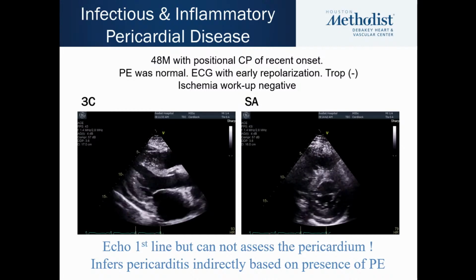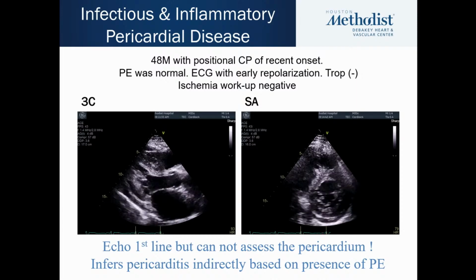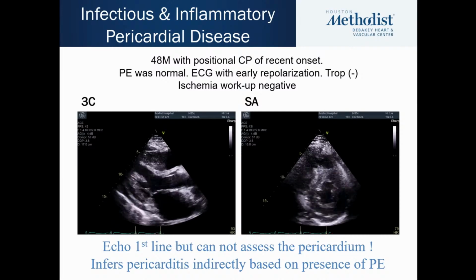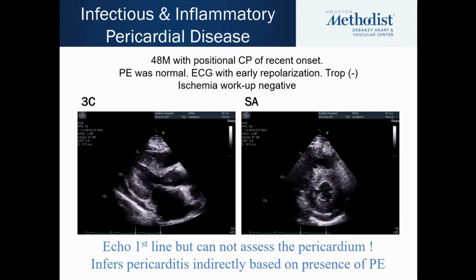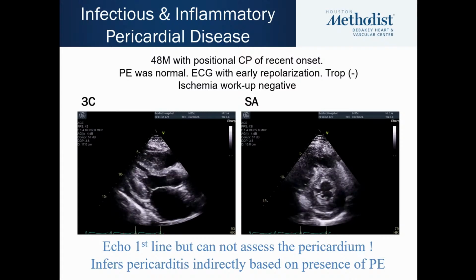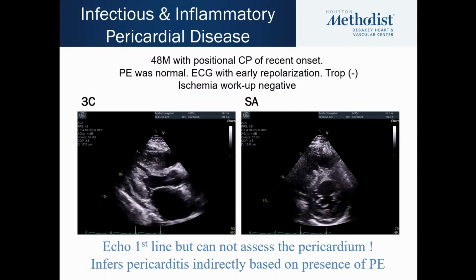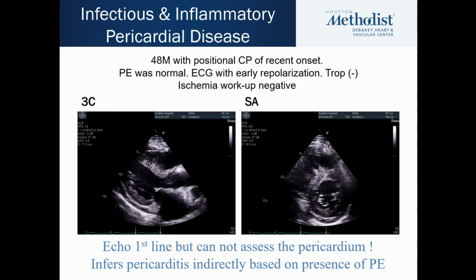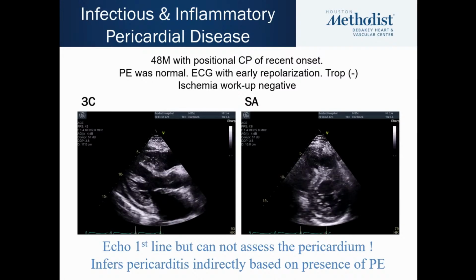And then here are the echo images. And I think we'll all agree, image quality is very good, function looks great, both of the left and right ventricles, the sizes look good. And you may notice that there seems to be a little bit of an echolucent space in the posterior lateral wall. Now, 2 points I want to make. One, I think this was mentioned earlier by Dr. Malahfji, it can be difficult. Is this fluid? Is this just epicardial fat? This can all be very, very challenging.